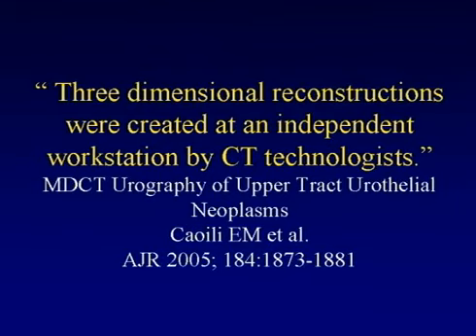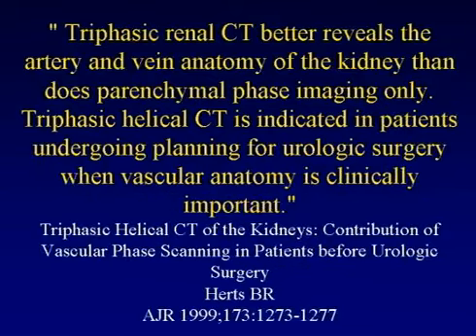You have to look at the images yourself, and I think one of the critical things in this whole visualization concept, you heard Elliot Fishman this morning talking about the pancreas in that regard, is that it needs to be an interactive process. So when you look at the 3Ds of the kidneys, you're looking at the MPRs, you're looking at the axials, you're doing an integrated approach. Getting 3D images from somebody else and saying 3D is not accurate is probably a very unfair statement.